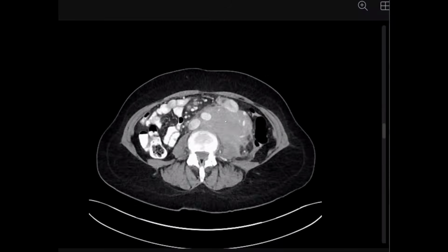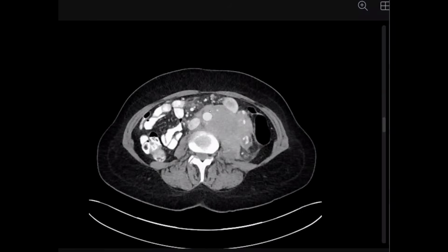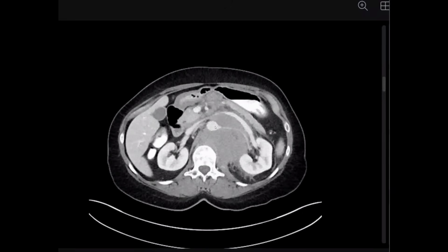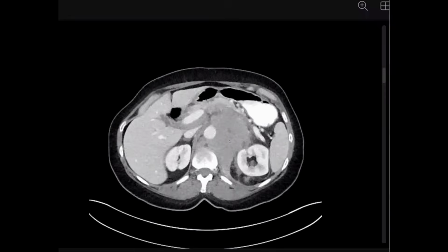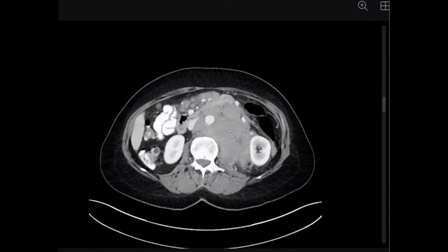What did you say? We have retroperitoneal masses, para-aortic, paracaval or aortocaval. We have also mesenteric lymph nodes encasing the mesenteric vessels. These retroperitoneal masses are encasing and compressing the left renal vessels and stretching the left renal vessels without any vascular obstruction. We have also these masses encasing the ureters without any obstruction.